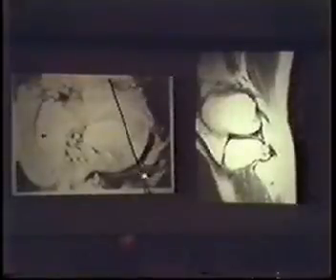If we go to the lateral meniscus, notice how symmetric the posterior and anterior horns are. And this can be important because if you have a sagittal image and the posterior and anterior horns are not symmetric in the lateral meniscus, it means there's something wrong. It could mean that there is a cyst which is involving part of the meniscus, or it could be that the patient may have had an oblique tear where the central fragment has moved into the notch and you're not seeing it.